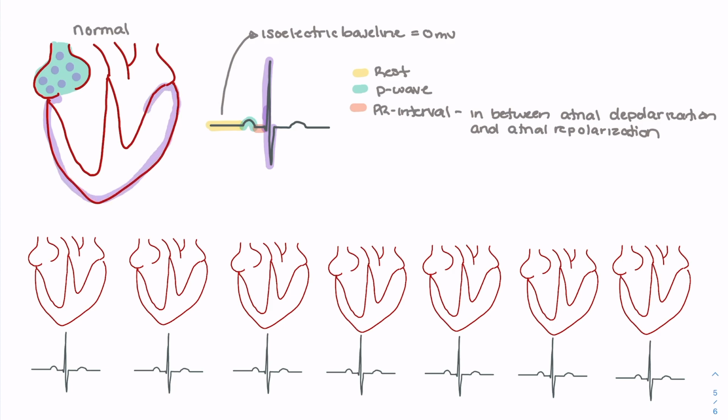So that big QRS complex is representative of our ventricles firing, or the myocardial contraction of the ventricles. The QRS complex is indicating that we have a heart where the ventricles are firing. It is showing us a flow of ions because we're having electricity flowing down the ventricles, activating that myocardial tissue, which is allowing for contraction.